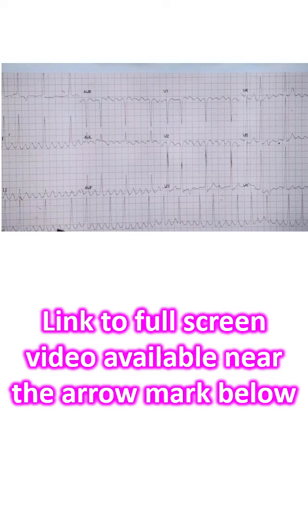Here you have two RR intervals and there are three flutter waves in between. But this is not 3:1 conduction, but 4:1 conduction, because you see the interval between these two P waves and the interval between these two flutter waves, not P waves. So this is double. So naturally there is one flutter wave hidden within the QRS. So if you count that, that will be 4:1 flutter.